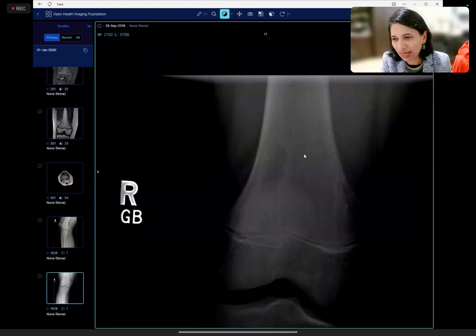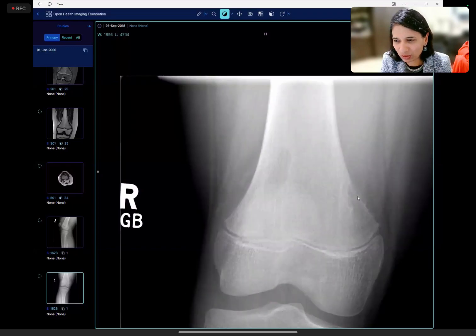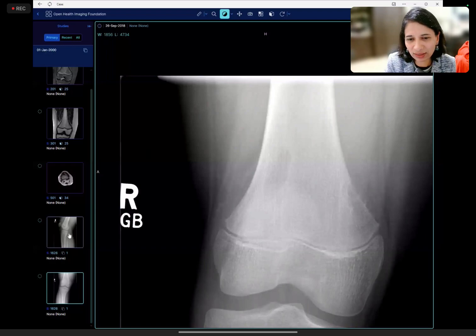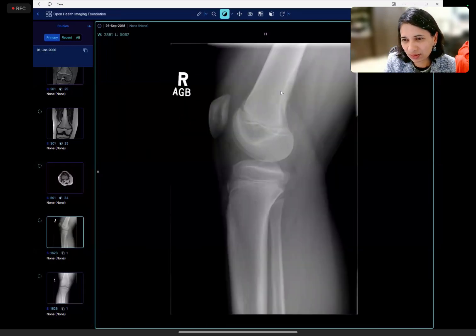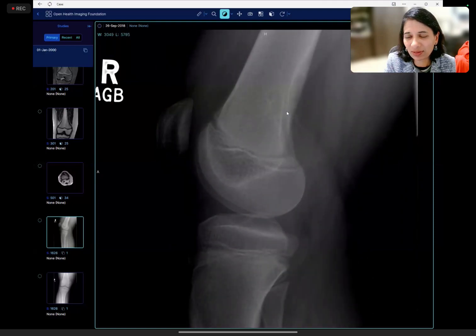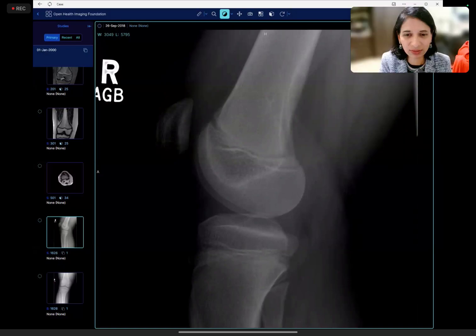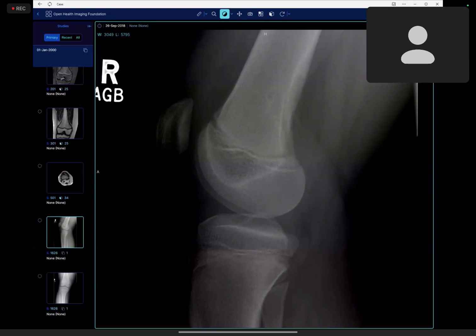And remember that soap bubble appearance of the non-ossifying fibroma. That's what you're seeing, as if you're looking at it from the side, and the fact that it is cortical based. So you can give non-ossifying fibroma, but I think the examiner will ask, where are these located? Are they medullary or are they cortically based? And if it's cortically based, it's benign. There's not many more things that you can think of. Yes, thank you. Okay, no worries.